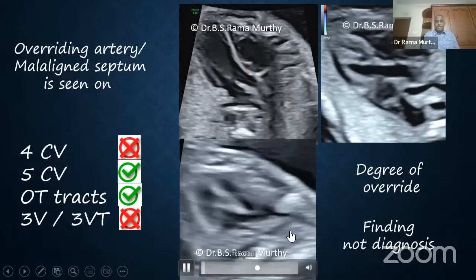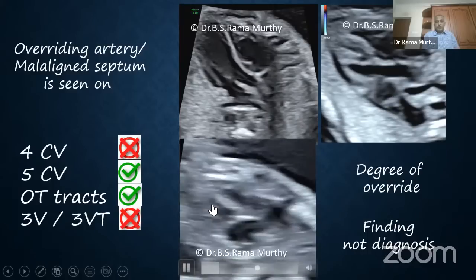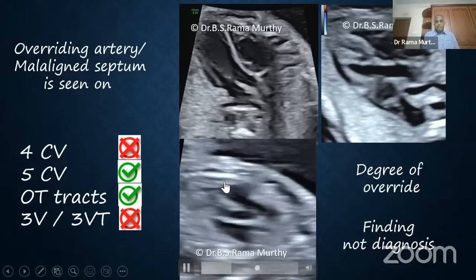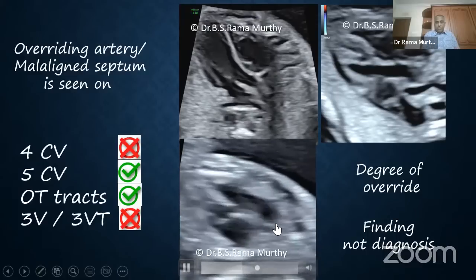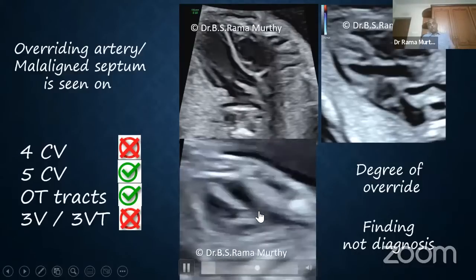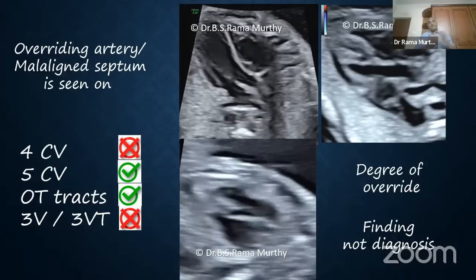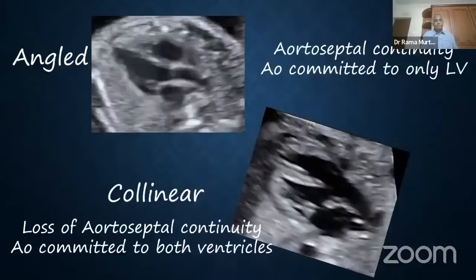Remember, this is the spine, this is the sternum, this is the anterior chamber, the right ventricle, posterior chamber, the left ventricle, the interventricular septum, and this is the malaligned VSD here. More of the right ventricle is committed to the overriding aorta or artery, whereas less of the left ventricle is committed to the overriding artery. So that is important because as we move on, we will know how this feature helps us to differentiate between tetralogy of Fallot on one side and a DORV TOF type or tetralogy type on the other hand.